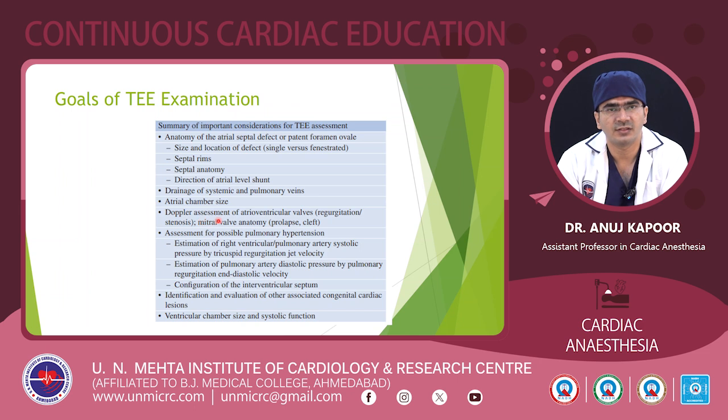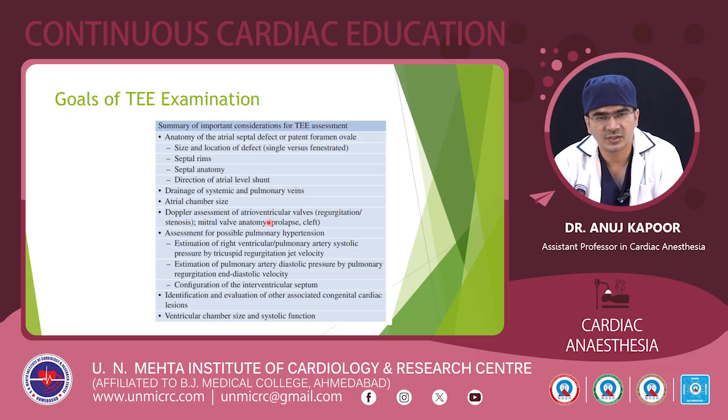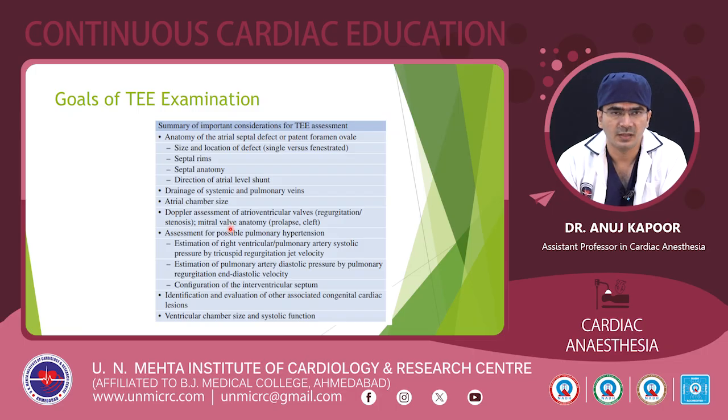We'll also have to do a Doppler assessment of the AV valves, and the mitral valve anatomy, especially in cases of AVCD, atrioventricular canal defect. We have seen that there is also a mitral cleft and there is MR. So we'll have to assess the mitral valve for any cleft or any mitral regurgitation, and also the tricuspid valve for any abnormality or regurgitation.